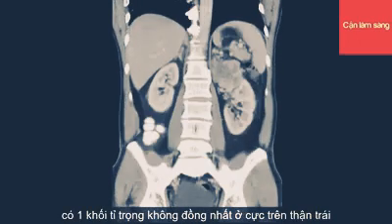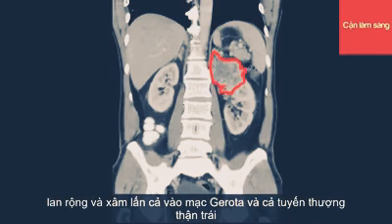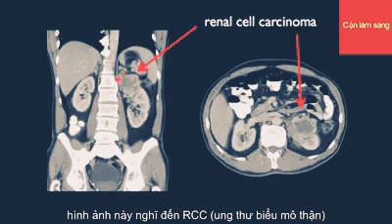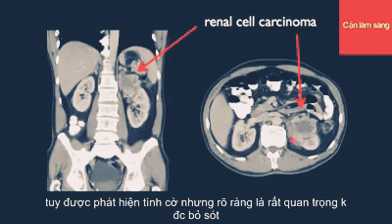Here in the left renal upper pole there is a heterogeneous mass which is quite large and is invading beyond Gerota's fascia and probably getting into the left adrenal gland. This appearance is consistent with a renal cell carcinoma, which was an incidental finding in this patient, but obviously a very important one.